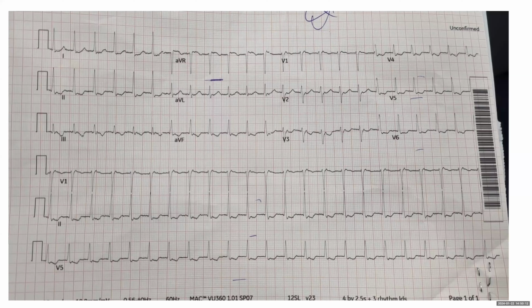Compared to baseline, exactly. Compared to baseline. And the same thing in V1 is in the inferior leads. You see this? These are P waves, pseudo S wave. When you see that, it's likely AVNRT, so that's one code. And then retrograde P is a fair one, always with AVNRT.